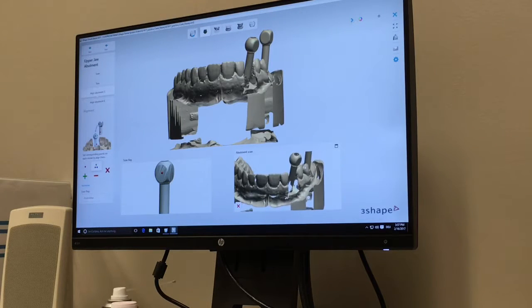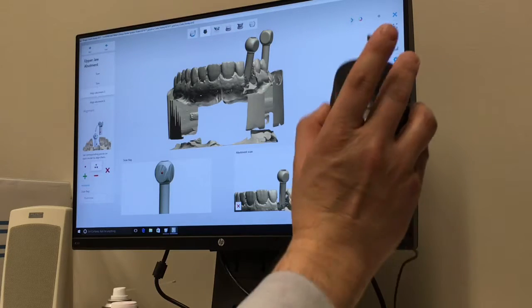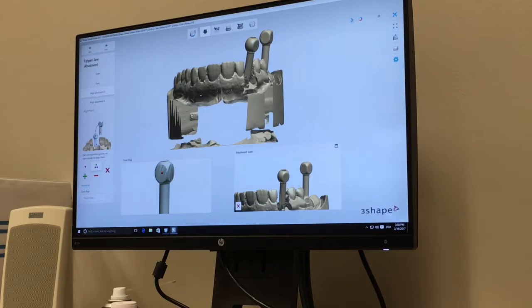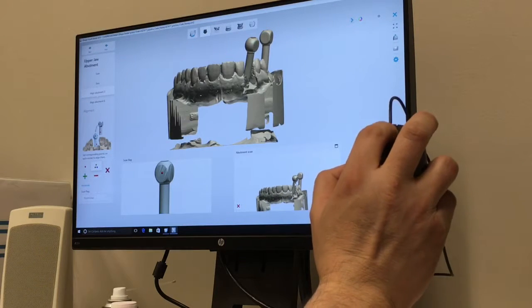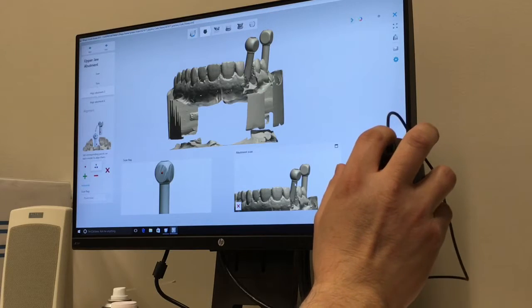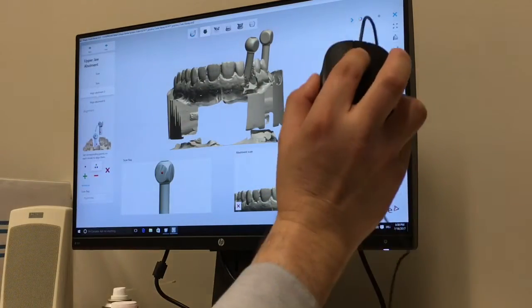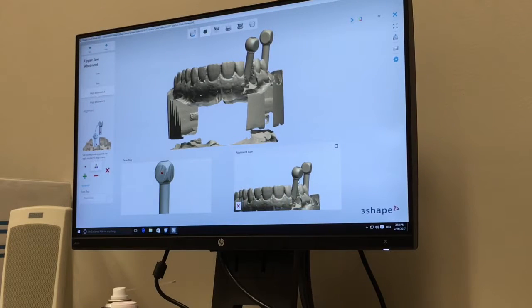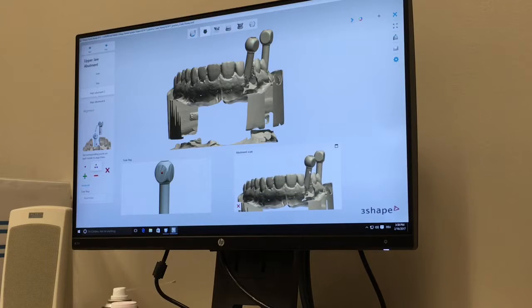And if you don't know what I'm doing with my mouse to get it to do these things, holding this down will move the cast left and right and up and down and all that good stuff. To pull out of the scene, you scroll with your mouse. To move the scene up and down, you push on the mouse and you move the whole scene around, okay?